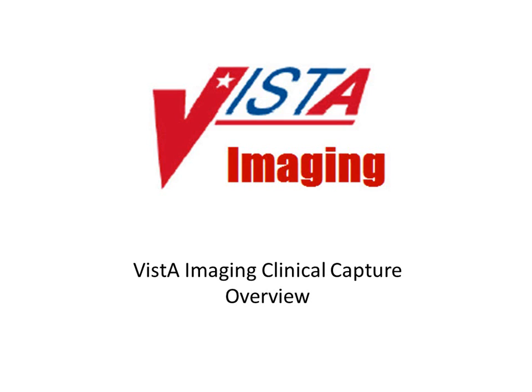On behalf of the software development and support staff associated with Vista Imaging, my name is Cliff Sorensen, and I will be your guide for this series of video training modules covering the configuration and use of the Vista Imaging Clinical Capture application. There are several modules associated with this presentation which will demonstrate the functionality of the software.